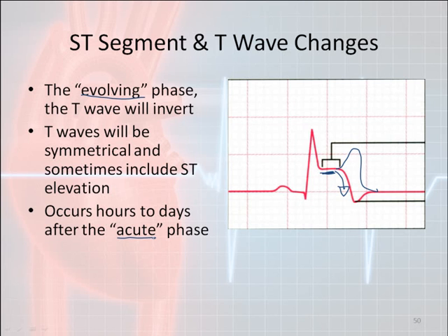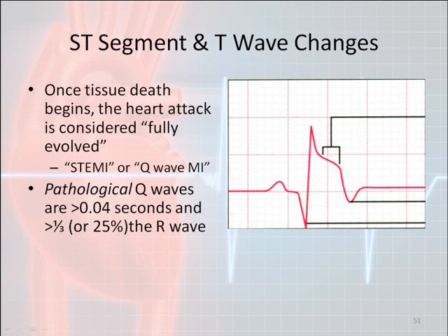One thing to remember is that up to this point, technically this is all ischemia. No infarction has actually occurred yet. If infarction does occur, then you will have something called fully evolved. What do we mean by fully evolved?